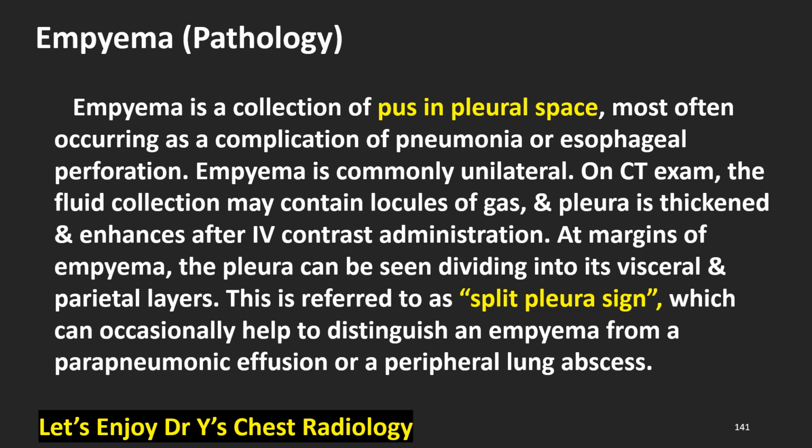Empyema pathology. Empyema is a collection of pus in the pleural space, most often occurring as a complication of pneumonia or esophageal perforation. Empyema is commonly unilateral. On CT exam, the fluid collection may contain locules of gas and the pleura is thickened and enhances after IV contrast administration.